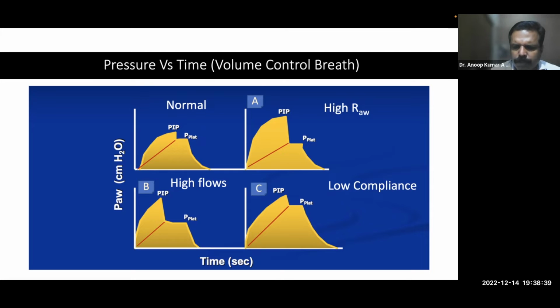So there are two types of lung pathology. One is an obstructive airway disease-like pathology, or we have an ARDS-like pathology. And obviously we have a normal lung. So we will usually have these three scenarios whenever we come across mechanical ventilation. We can have a normal patient, like you are ventilating a patient for muscle paralysis, or for a CNS reason where the patient has a low sensorium. In these situations, you will have an absolutely normal lung with normal compliance and normal airway pressures.